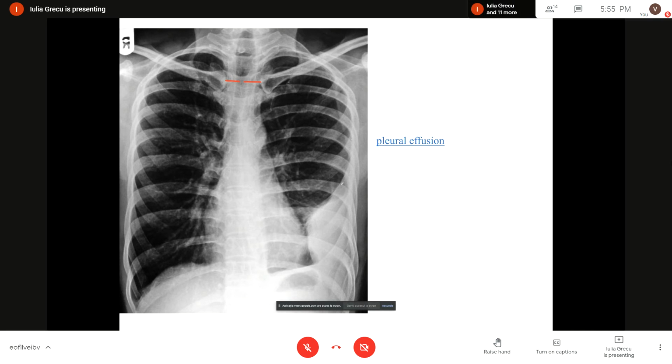Okay. Towards the margin or towards the lung? So it's sharply delimited towards the lung. Okay, and it is a bit more diffuse and blunting, as you said before, towards the costodiaphragmatic angle.